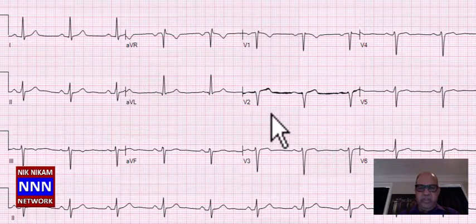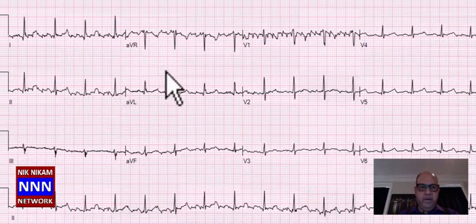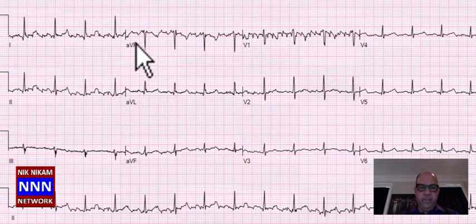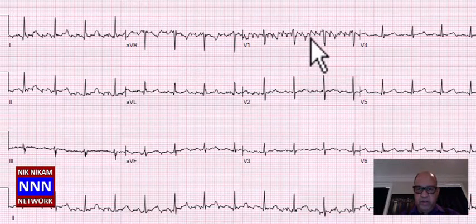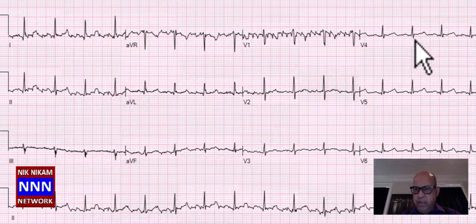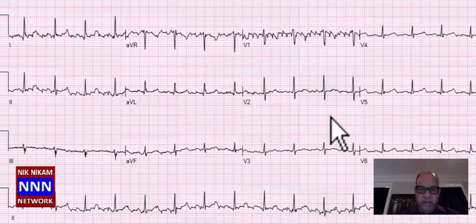So this is a sinus rhythm with the loss of R waves anterolaterally, along with baseline artifacts. This is called baseline artifact. This is not atrial fibrillation or atrial flutter, because these cycles are almost like 600. This may be what is called the 60 cycle baseline artifact. Sometimes it's hard to find out what the rhythm is, but if you look here, we have a P, QRS, P, QRS, P, QRS. So this is sinus rhythm with the baseline artifact and non-specific T wave changes.